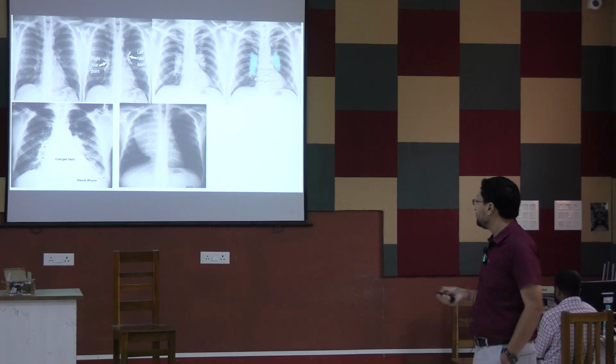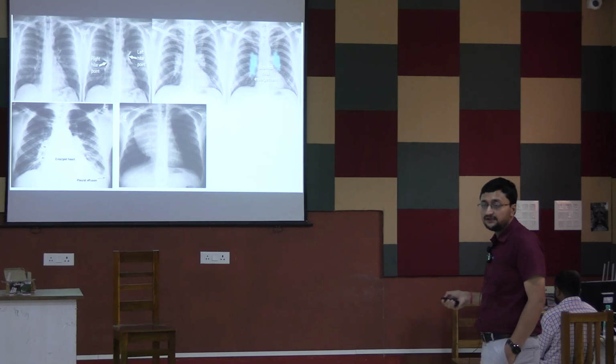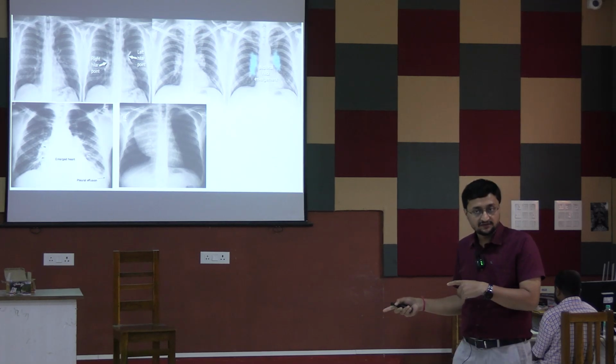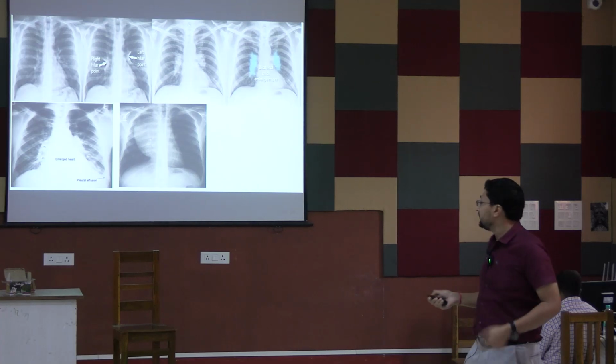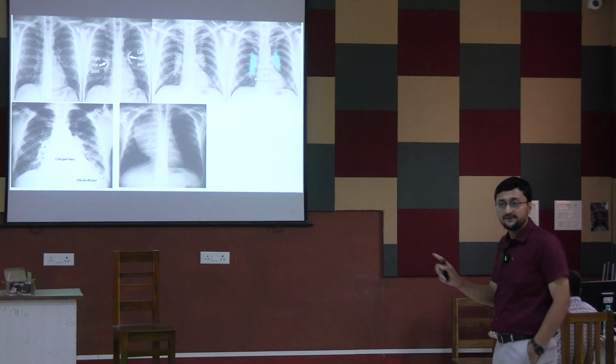Why? Because this is the mediastinum, and the mediastinum is enlarged first, and second is the shadow is overlapping the hilum. The hilum is not visible.